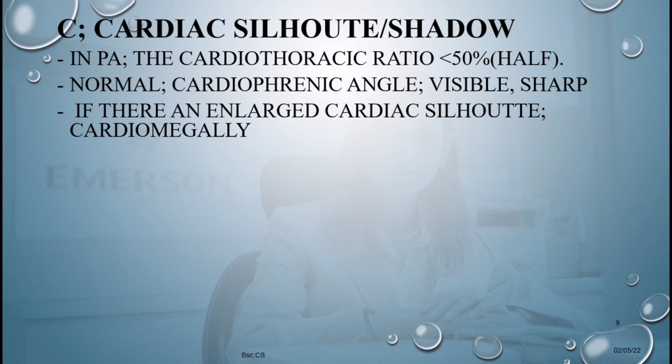Then you have to put it across the chest, from where the first lung parenchyma markings are. So this is hard to explain without me showing you, but you can just use your fingers, start where you are seeing the cardiac shadow.